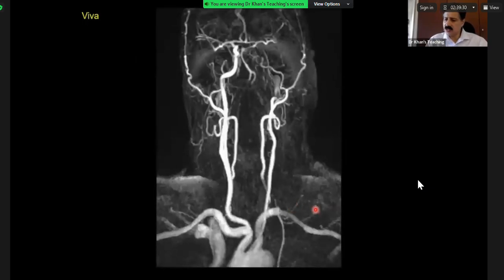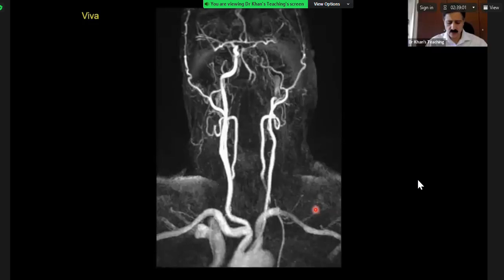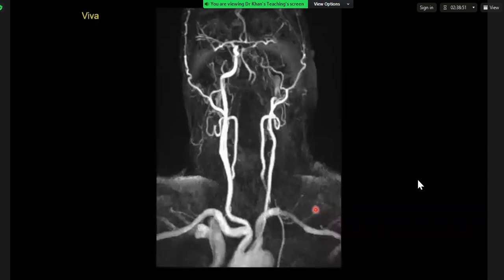But I'll come back to that point. Okay, this is your last case, candidate 1. So I've got a whole time of flight MRA for the arch vessels up to the intracranial fossa, and there is no opacification of the left ICA from the point at which proximally. So I've got an ICA thrombus relatively proximal, so inferior, prior to it going into the brain, so in the neck.